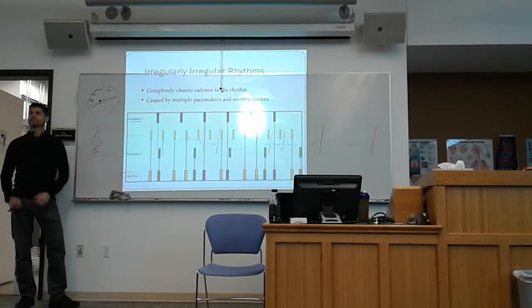It is. So when are you going to be able to differentiate between a not consistent firing of the pacemaker cell that's damaged to the pacemaker itself? Because right now you're describing there's nothing wrong with the pacemaker cells. Correct. In this particular example, that is a correct statement.